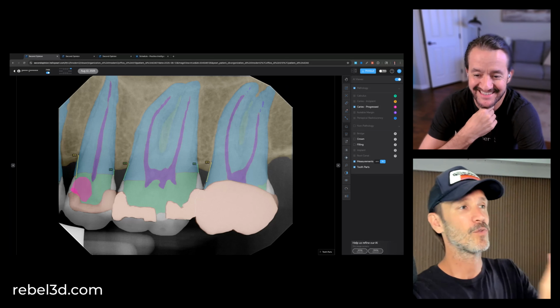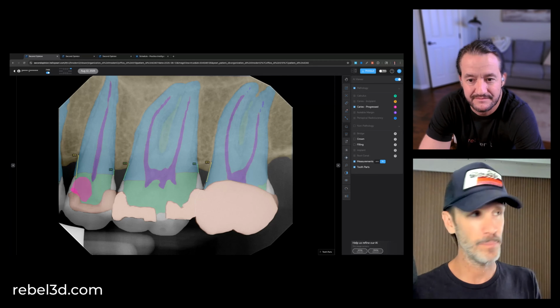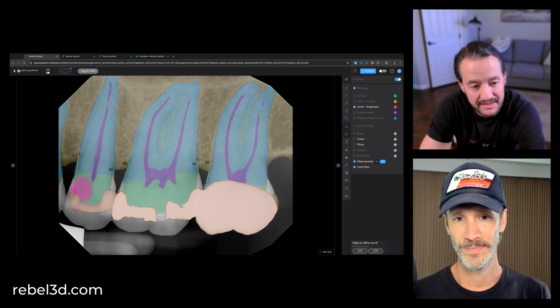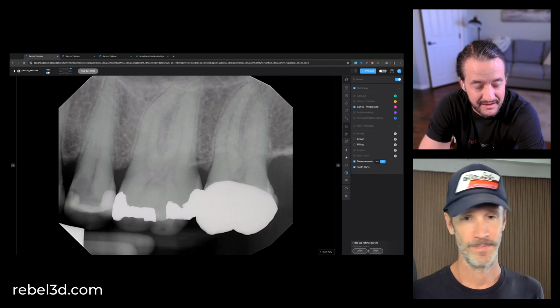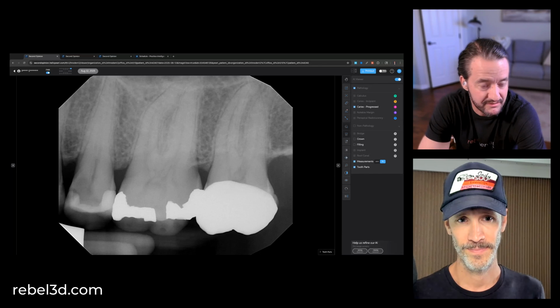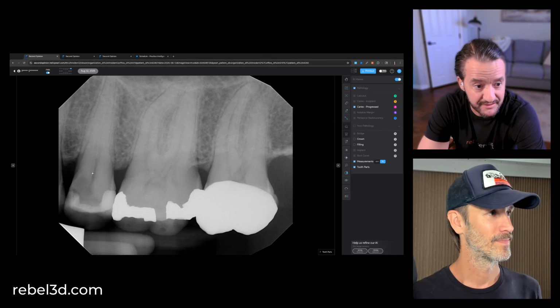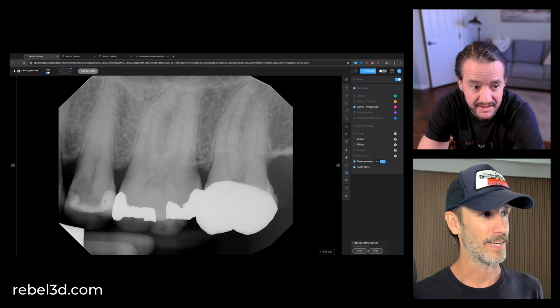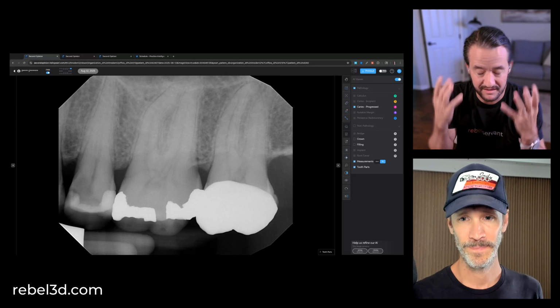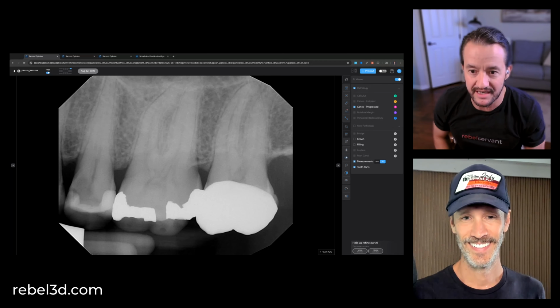Yeah. Now, this, of course, is a two-dimensional image of a three-dimensional object, so there can be some overlap, but this is actually a pretty big cavity. Wow. So go back to before Pearl. Yeah, I will say I'm not an expert at looking at radiographs. It would be hard for me to discern the significance of that gray area, right? Yeah. I can see there's a slight shade gradation, dark gray to light gray. But there's no dramatic effect as to what I'm perceiving as a patient.